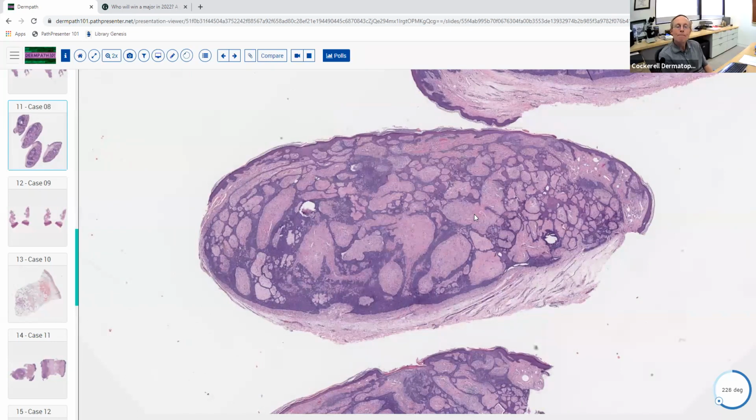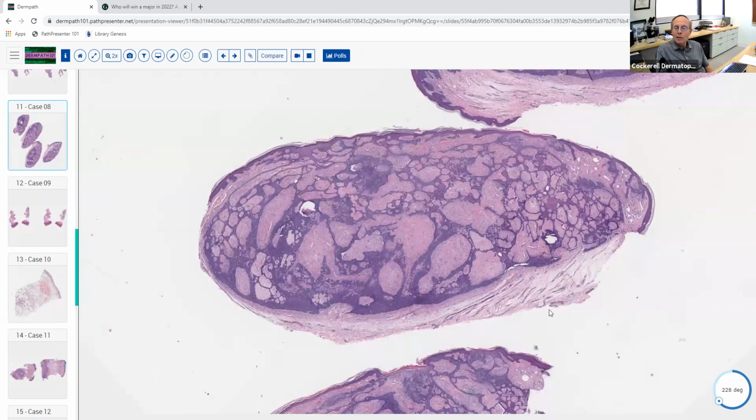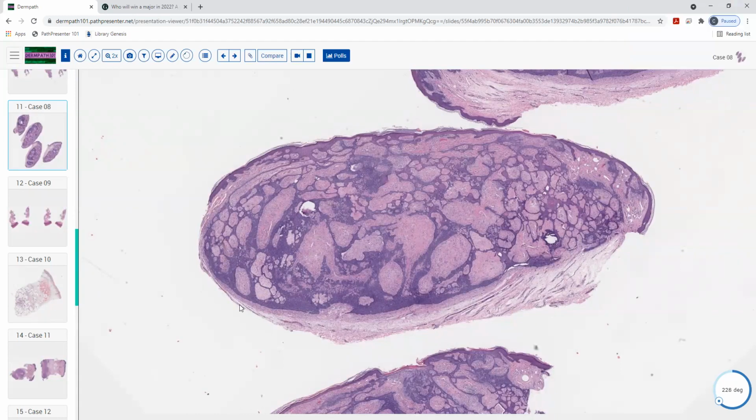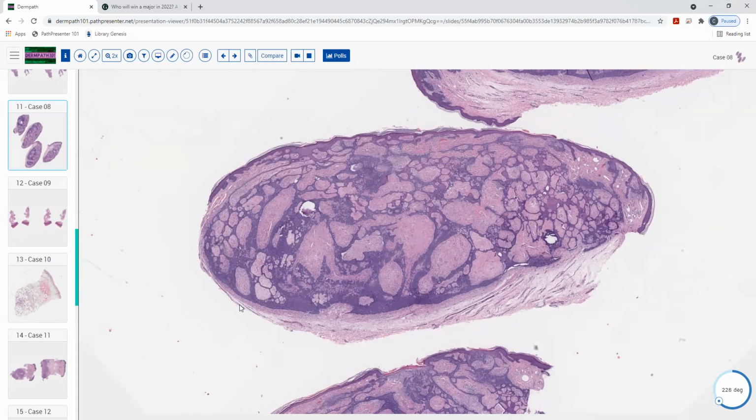Okay, perfect. So this looks like maybe a shave of a pedunculated type lesion. Yeah, it might have been sessile or sticking above the skin, and they just shaved off the whole thing. Absolutely. And there's this proliferation of anastomosing basaloid strands. So I favor more of a neoplasm here. Good. Neoplasm. Epithelial or non-epithelial? I would say epithelial.